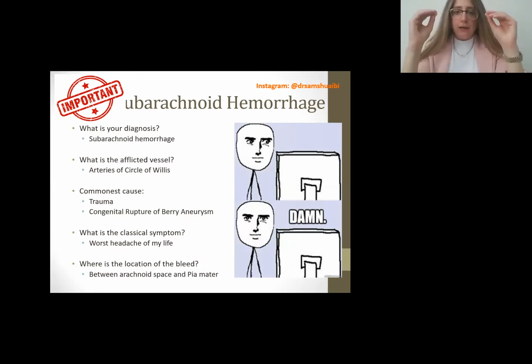If you have a test on test day and you didn't have a chance to go through these hemorrhages, take a capture of all these that I have just uploaded and just go through them. Anytime you have a 5-minute break, as I said, in the bus, in the taxi, whatever, just go through them. What is the diagnosis?